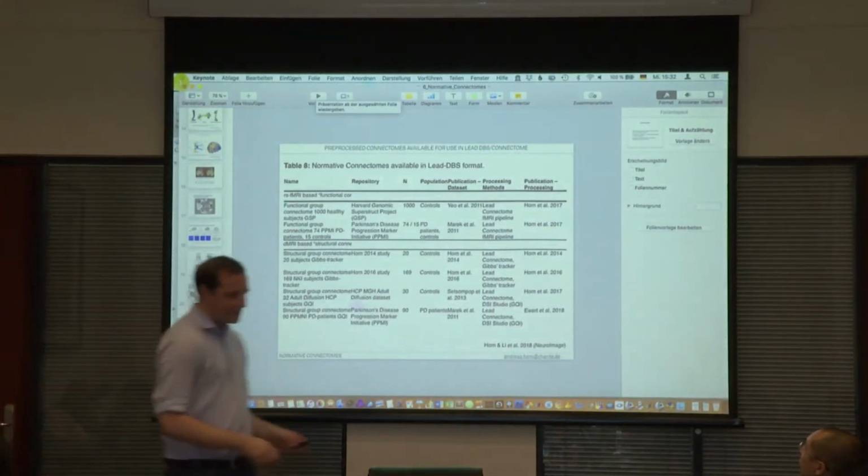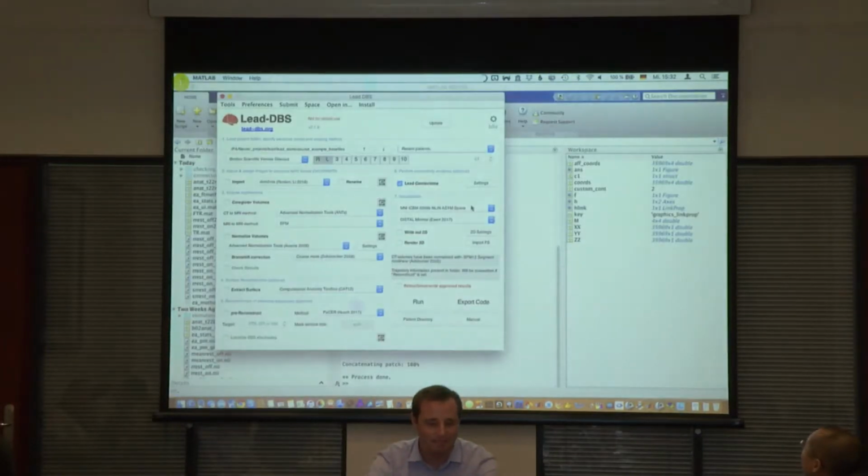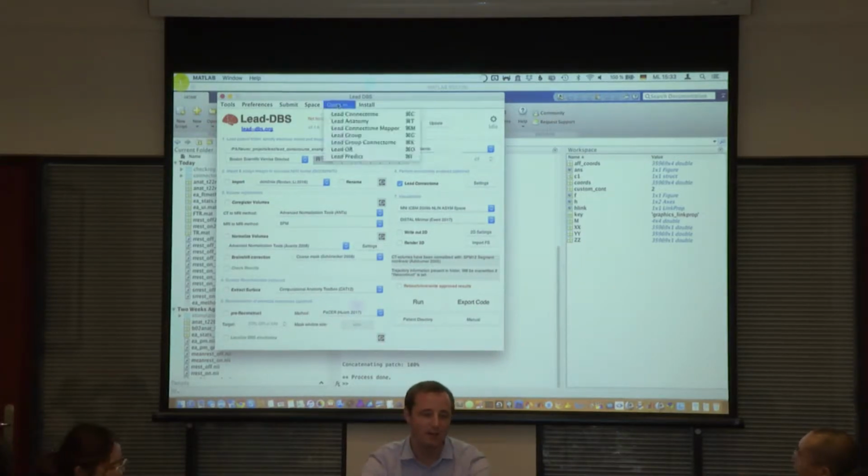And that is everything for this talk. And now I would want to start using it. And what I want to do is open the same subject as we have done before.